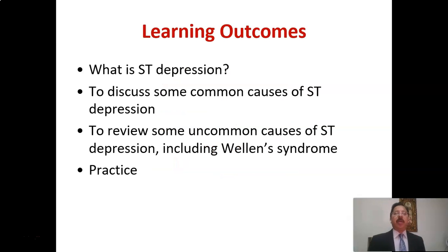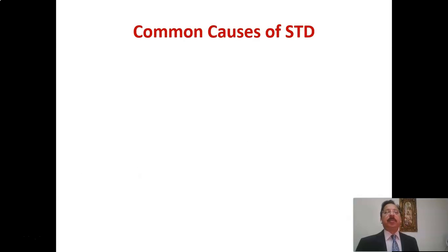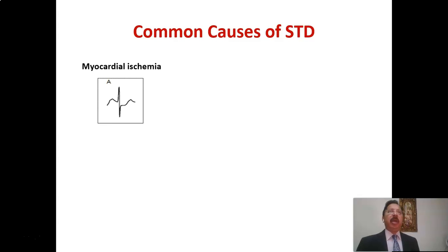And here in this topic we'll learn what ST segment depression is, and we'll go through some common causes of ST segment depression as well as some uncommon causes, especially Wellens syndrome, and we'll practice some ECG strips.